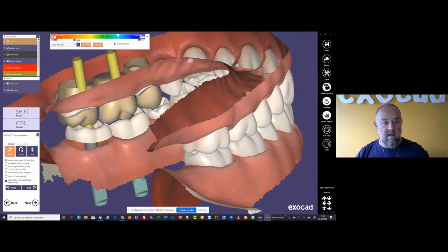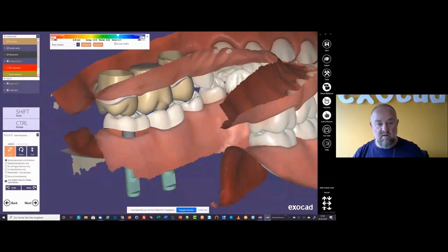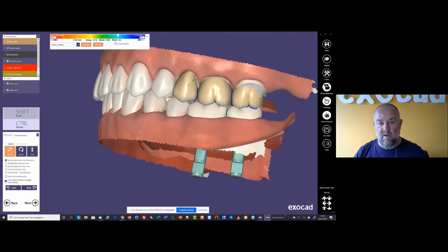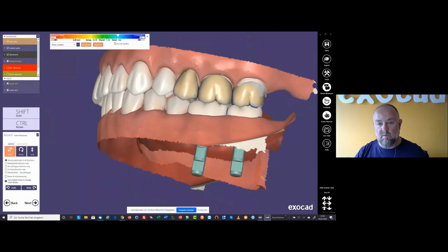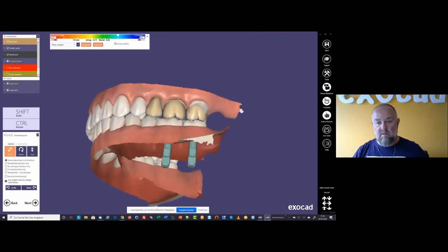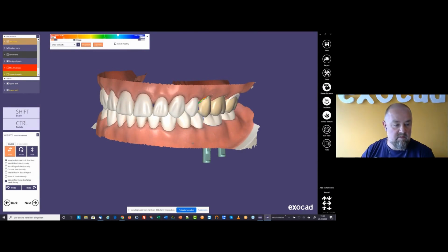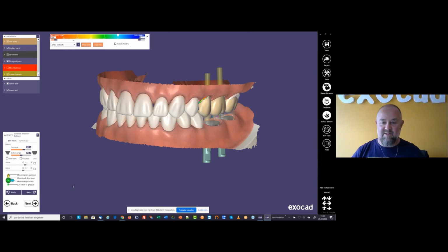Yeah, you see the screw channels. I will hide them because I don't need them at all here during my design. Okay, like this. Perfect, I think. Great. This one is maybe a little bit too big. And yeah. Okay, and now it will be interesting. So when we are clicking to the next step, no, it's coming later. Sorry for that.